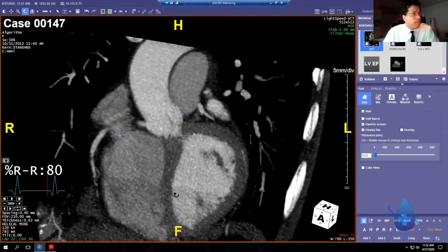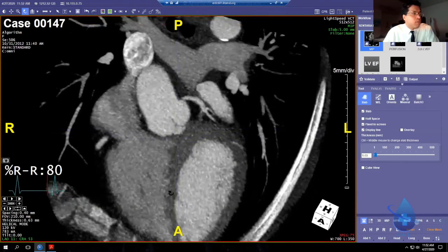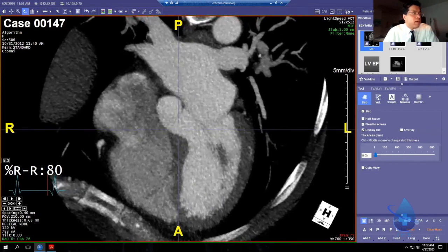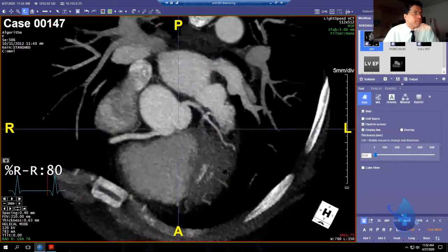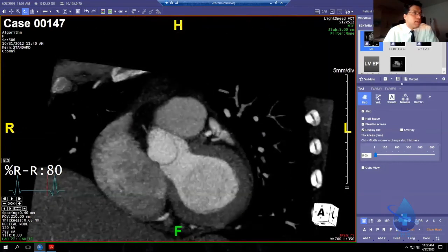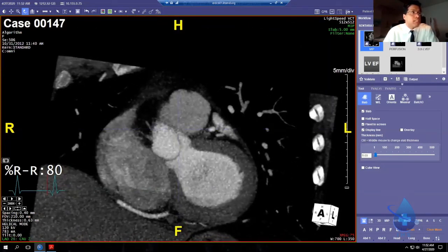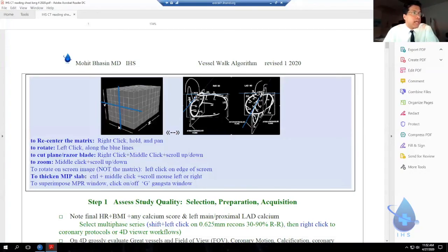So if you are looking at a four-chamber view, if I want to show the AV groove, I should make a rotation along the blue line, left and right along this blue line here, or north and south, because north and south moves along that target are going to be along the natural grooves of the cardiac fibrous skeleton. Make sense?